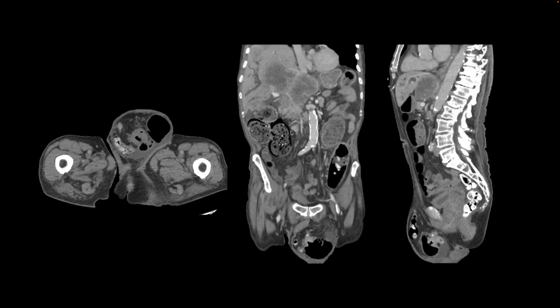This is another patient who presented with metastatic disease. We see here that there are hypodense large masses in the liver, and it turns out that their primary is in the colon, which is seen right here inside the hernia. And so a part of the colon has herniated into the left side of the scrotum, and that part of the sigmoid colon has this apple core lesion, which was their primary colonic adenocarcinoma.